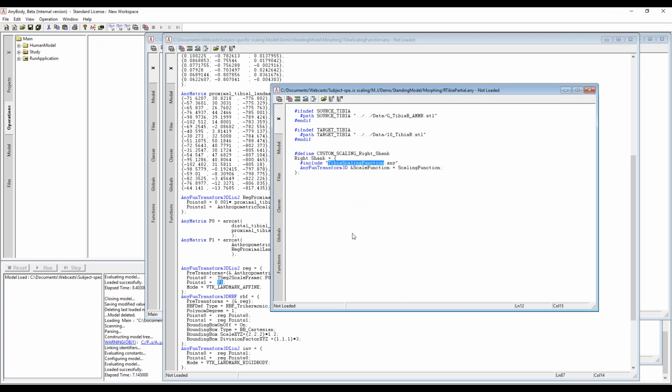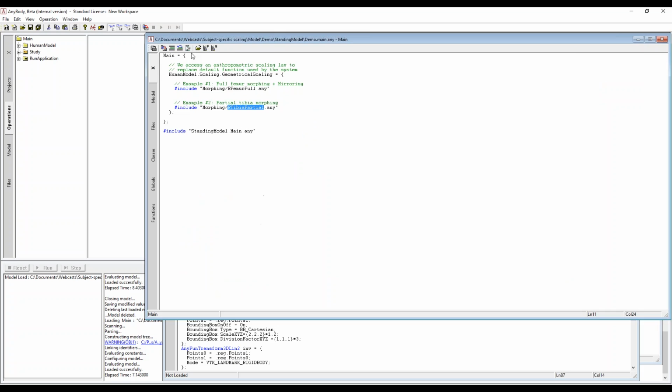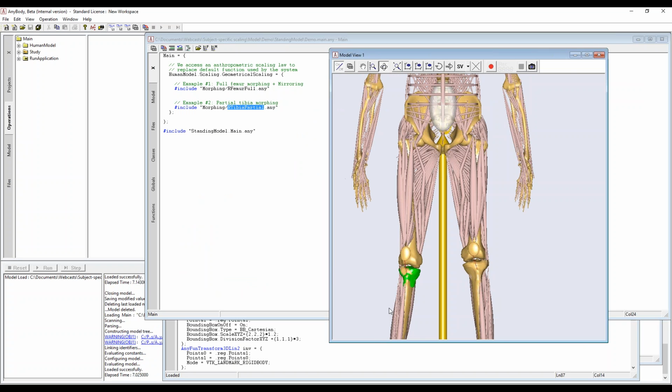And it ends up in a picture like that. Just give me a second. If I reload it, what you should see is that our tibia changes a little bit. Yes, as you can see, it shrank a little bit and now has an almost similar size to the green surface.